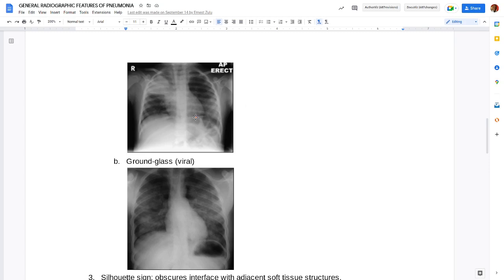Do you notice that the lower part is straight? The lower part of the patch, which you were telling me was the abnormality. Yes, exactly, the lower part of that white patch. You've seen how straight it is compared to the upper part, which is caved. It looks a bit caved on top, but the bottom part looks straight.